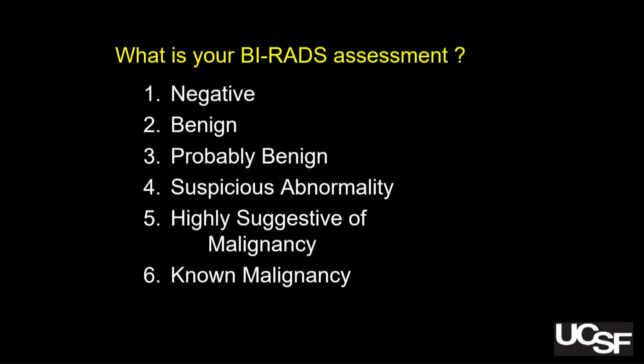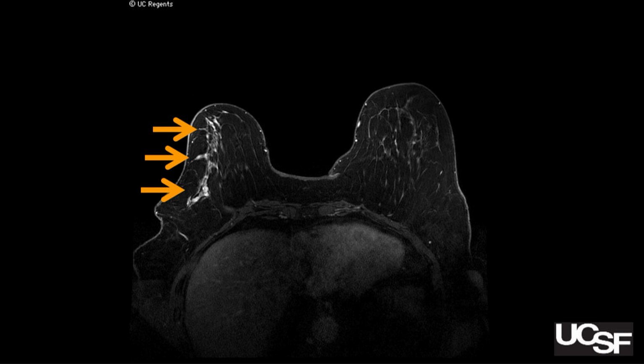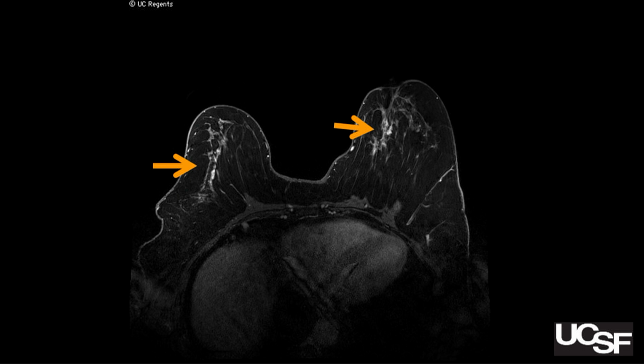So since it's late afternoon and we all had lunch, I'm going to just show you the findings. So this is show and tell. There's a bunch of linear enhancement, non-mass enhancement on the right. There's also some similar appearing enhancement on the left.